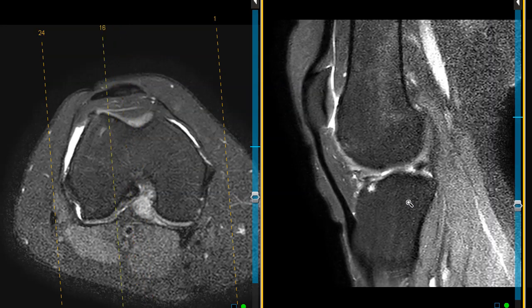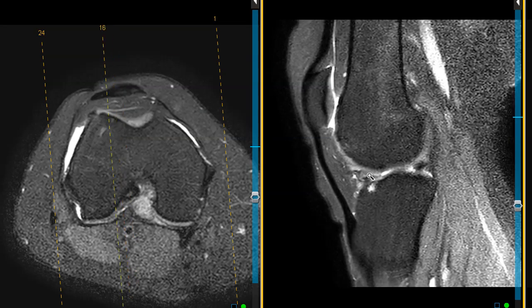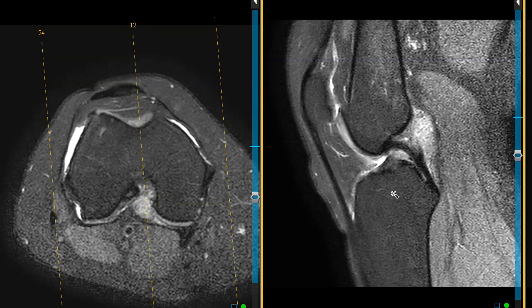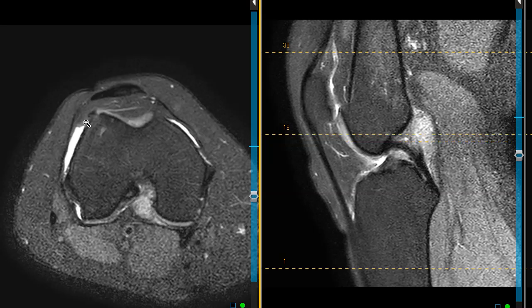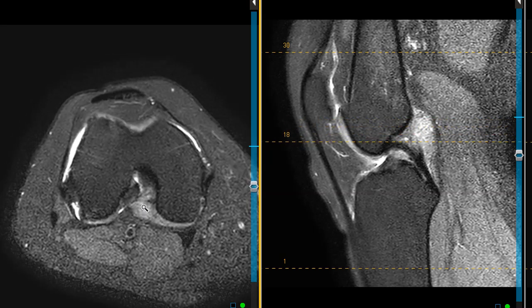The patient also had another area right here, a little area that looked like localized synovial inflammation, and that's it. So they can go resect this, and the patients do well. This will cause fullness in the knee and knee pain. And it is unclear whether her symptoms are related to this patellofemoral disease, with the erosion and some reactive fluid. That is probably the main thing, but this definitely may contribute to some of her symptoms.